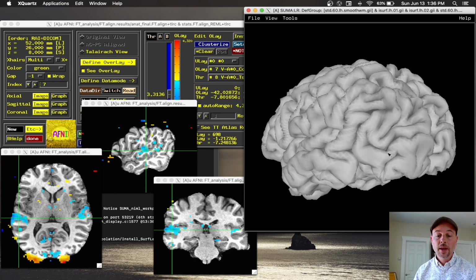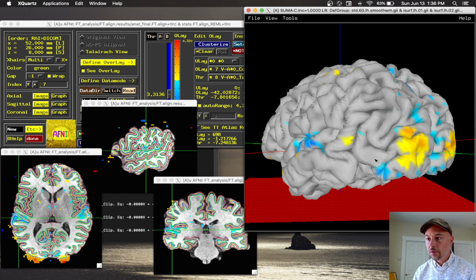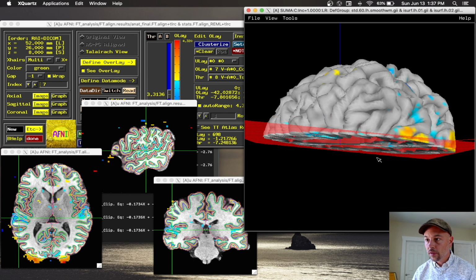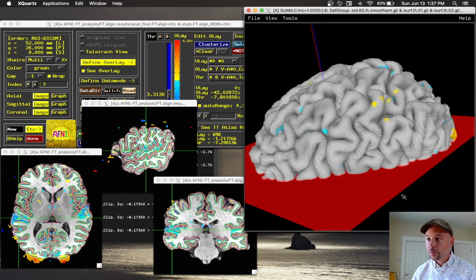and the white matter. If I start the GUIs talking, SUMA sends the surfaces to AFNI, and AFNI sends the stats to SUMA. Starting SUMA's clipping plane mode, a clipping plane is created, which I can move, I can rotate and tilt. I can move the whole brain, and you can see into the cortical ribbon, turning it off and on. Up to 6 of these can be made.